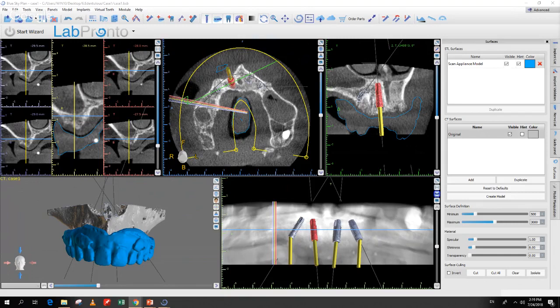Your question that just came in is a great question, and that's the next process flow we're going to discuss. We're going to show the triple merge technique. There are downsides to the triple merge technique. For example, you need to create the different components that we're going to discuss, you need to get them scanned, and there's more overhead in terms of merging everything together.